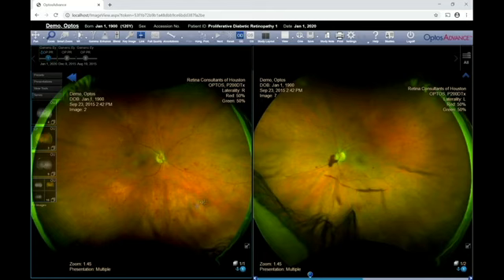To enhance the image, simultaneously hold down the Shift key and the right mouse button while moving the mouse towards the screen. The amount of enhancement applied is displayed at the bottom left of the image viewport, with 0 being default and 3.0 being the sharpest.